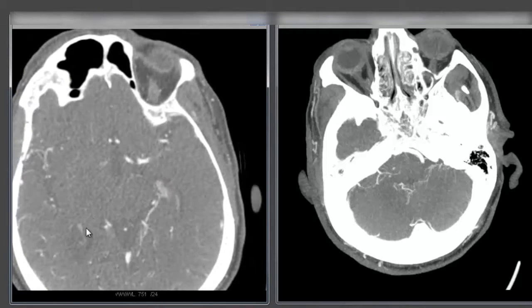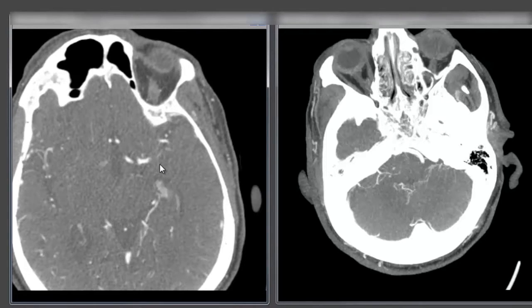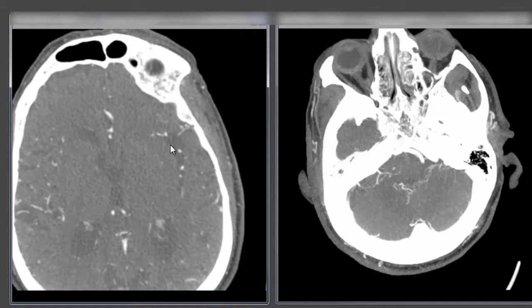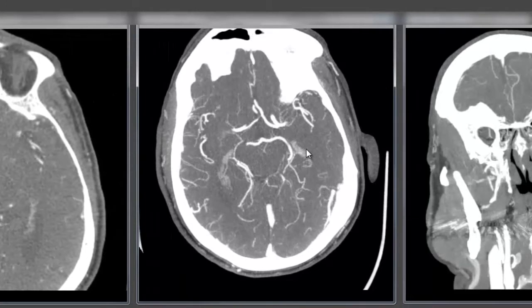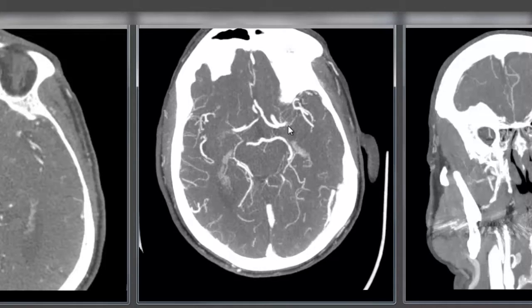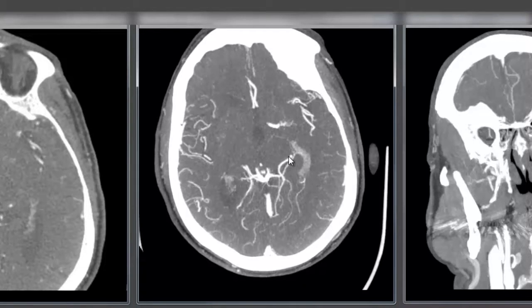again, we can window this to really put this into relief. We see some areas of contrast, probably in veins surrounding this area, but there is a hard cutoff right here. Then we see some reconstitution of the MCA territory distally by collateralization. We see the same thing here. On the thick MIPs, it becomes much more obvious. See that hard stop to the left M1 segment, proximal MCA stem, and then reconstitution of the distal branches with a clot occupying this space not filled with contrast.